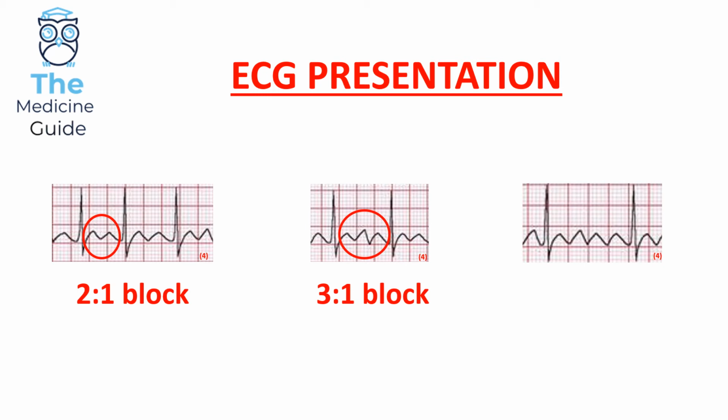So this is an example of atrial flutter with a 4:1 block because there are 4 flutter waves present after each QRS complex. Hopefully you should feel a little bit more confident in interpreting atrial flutter and also identifying the type of AV block that's present, because this is something that they could quite easily throw into your knowledge paper exam.